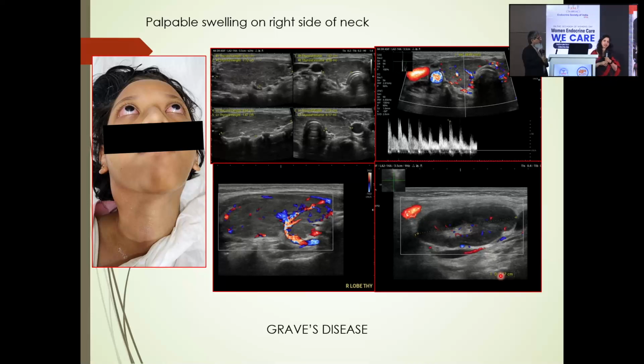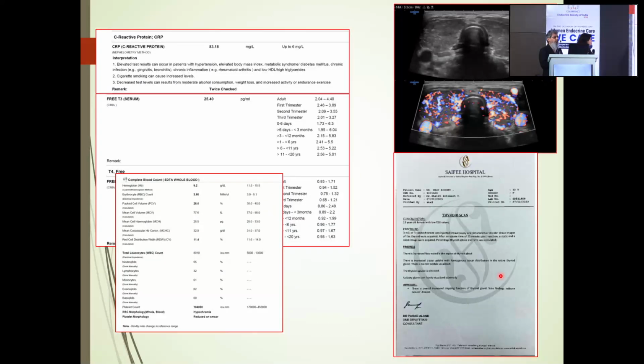A little bit about Graves, because we know we do the TC99 scan. We're just finishing off, it's the last one. So we do a TC99, but is there anything special which we see on the ultrasound? Yeah, I think it's the vascularity, the inferno, which is clinical. In this case, the patient actually came for the lymph node, but we found out she already had thyrotoxicosis. And this is one picture which you would see. There's a lot of vascularity.